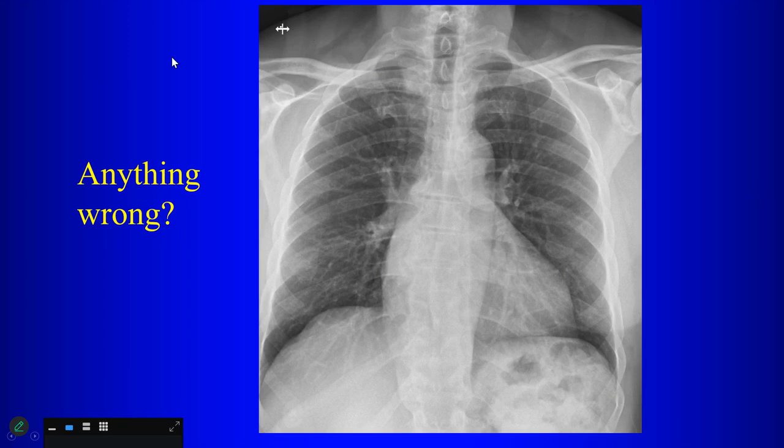Anything wrong here? Any line that bothers you? The diaphragm's irregular on the right. I think it's within the range of normal.